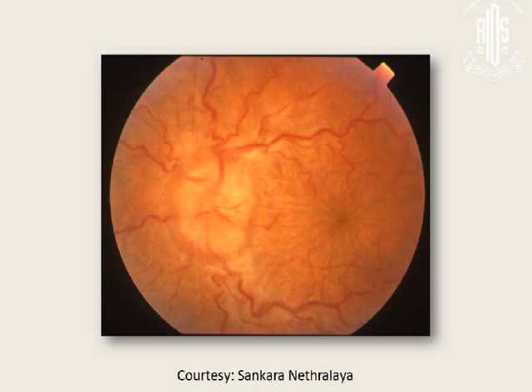This is another example of a disc edema. But you see something here in the macula. This is hypotonic maculopathy. This patient had glaucoma surgery in the past, and there was a whole filtering bleb that has resulted in hypotonia. This is disc edema. Axoplasmic stasis because of ocular hypotonia. The clue is the maculopathy. But again, this is edema because of hypotonia, not because of raised intracranial pressure.